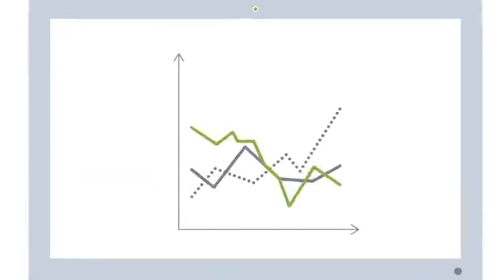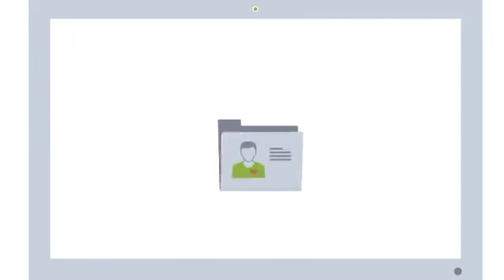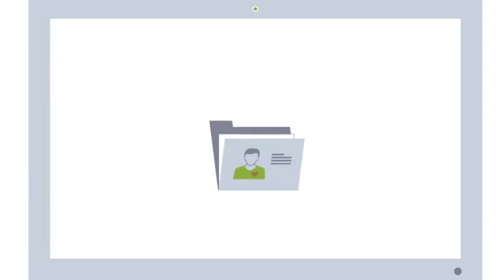MediConnect reads data from the programmer, displays it in an organized way, and stores it in a structured patient file. All data can be exchanged with the Hospital Information System, HIS, or EMR for further processing. This includes the receiving of patient demographics from the HIS and the forwarding of findings to the HIS. MediConnect supports the creation of all kinds of documents, such as referral letters or pacemaker IDs, which will then become part of the patient file as well.